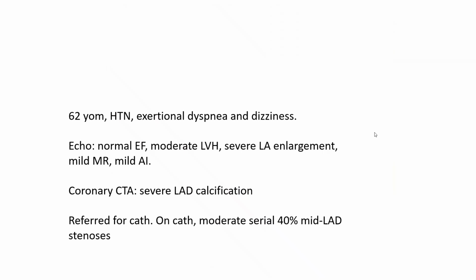This is another case. This is a 62-year-old man with hypertension. He's presenting with exertional dyspnea and dizziness over the last 6 months that made him really alter his lifestyle. On echo, he has normal EF, moderate LVH, severe left atrial enlargement, mild MR, mild AI.